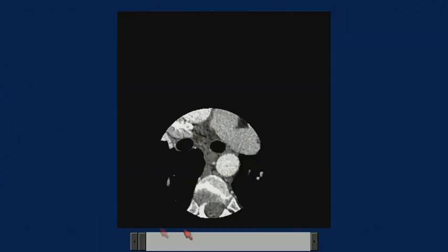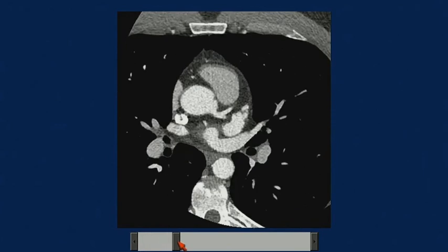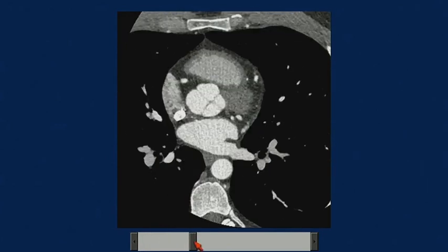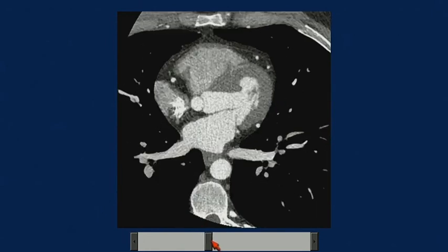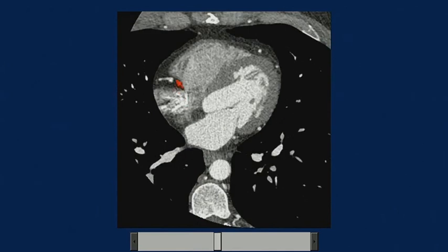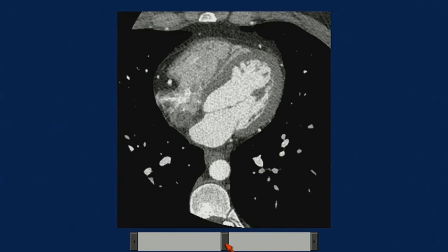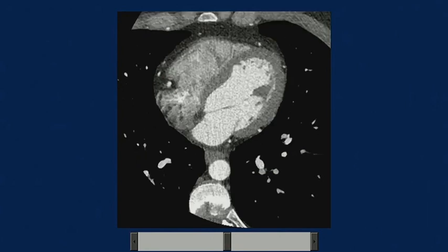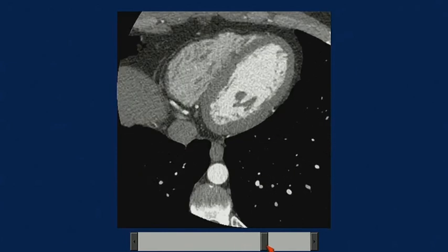So I'll show it to you again on the axial images, the right coronary artery branches we have so far reviewed. So here is our conus branch. If we keep following it, you can see this is our SA nodal branch. The right coronary artery is coursing again in the right AV groove. And here you can see a very prominent vessel coming off. This almost comes up right just before it's bent from that vertical to the horizontal segment. And you can see that this acute marginal branch is supplying the RV free wall.